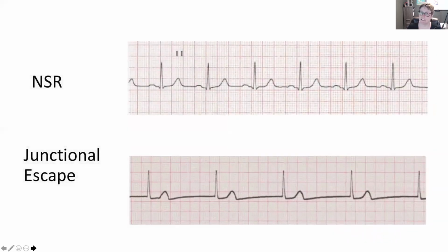So let's look at this in comparison to normal sinus rhythm. It definitely looks slower at the beginning, but I don't know if it's a sinus brady. I mean, it could very well be just at first look. It looks pretty regular, like I can rely on that beat showing up at a particular moment in time, which is consistent with normal sinus rhythm. This is also regular.